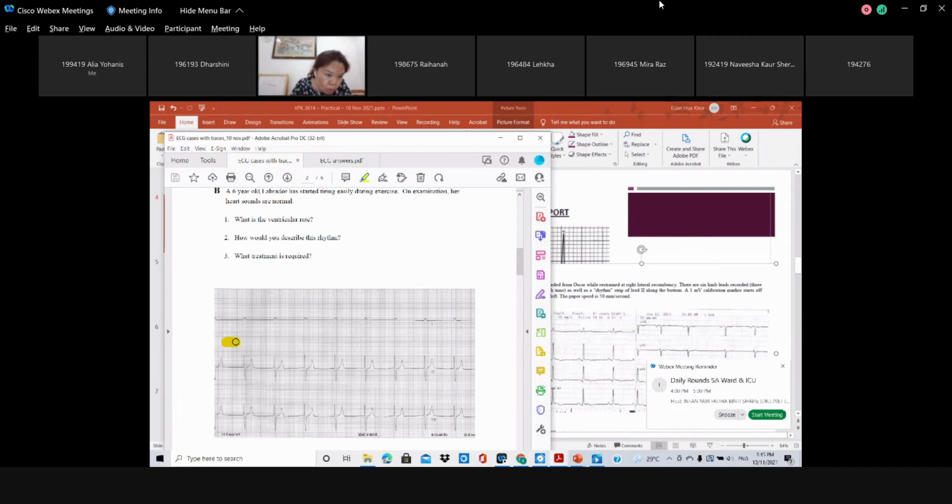3, 4, 5, 6, 7, 8, 9, 10, 11, 12, 13, 14, and 15 boxes. Group 2. Tak ada orang kat group 2 ke? What would be the ventricular rate?